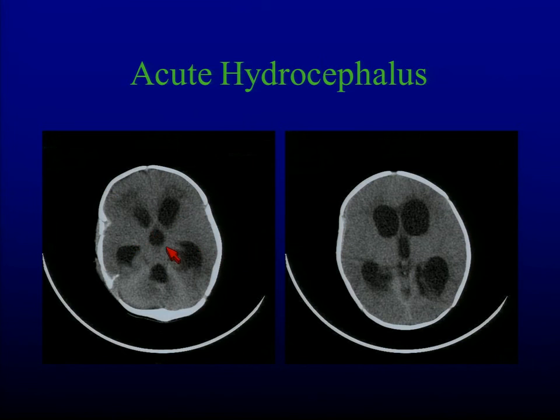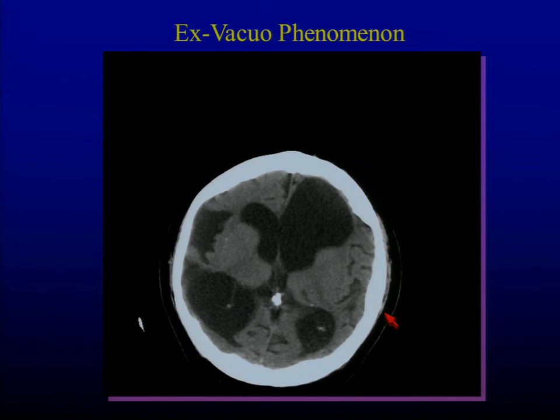Here's a couple examples. So third ventricle, lateral ventricle, look at the temporal tips. Remember what they're supposed to look like: a small comma or a slit. The first place that it grows is right there, the temporal tip. And that's my early warning system. Now, I don't need early warning on this one because I've got a late warning problem going on in both of these scans. But that's my early warning system. But, again, if you don't give me the other information, I can't tell you.